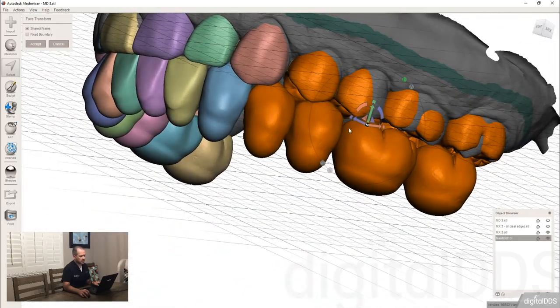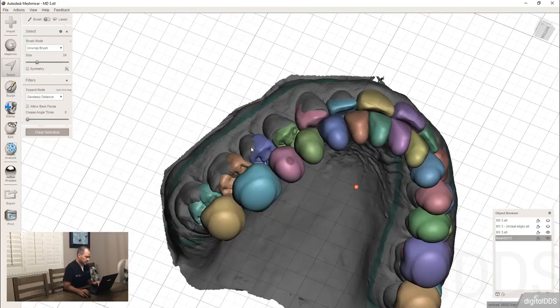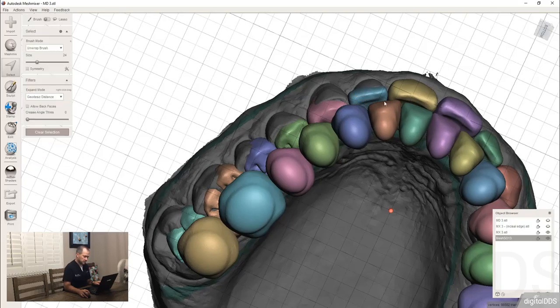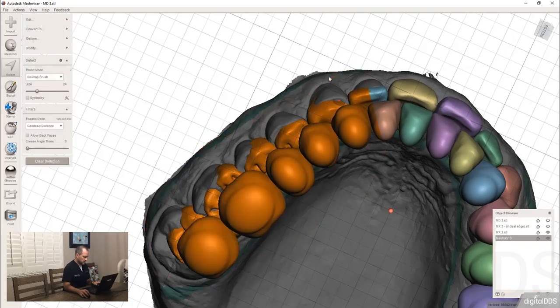And eventually I'm going to go individually to all these teeth, but right now I'm just taking advantage of the fact that they're together. Like I can easily just select certain ones. I can also do like this. Oops. I clicked outside of Mesh Mixer, down on my screen below, and then E, transform.